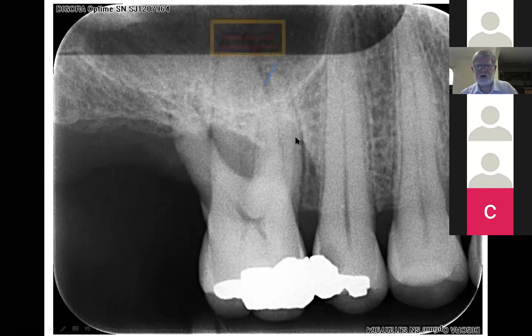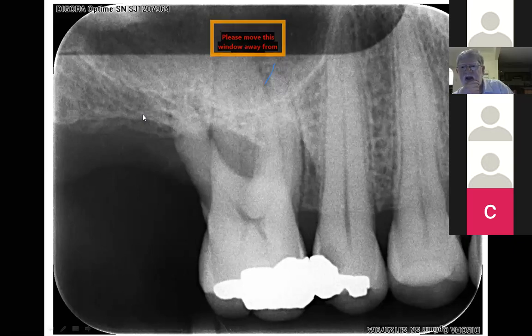Maybe severe periodontal bone loss. You could debride. That alone is not going to get any bone filling in there. Extraction, it's unlikely that you're going to get an OAC, unlikely. So often you'll see this where the sinus floor is sort of just undulating and the roots appear to be poking up into there, but they're either side of that.